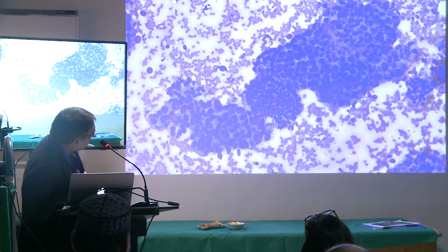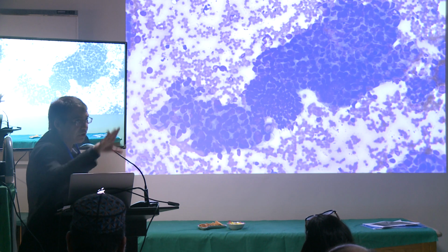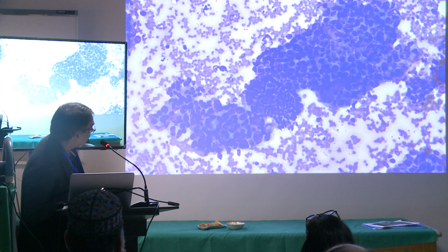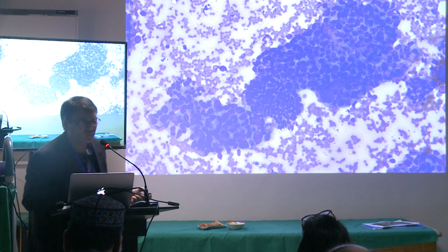Okay, and by the way, these are not from that patient. I have a slide from that patient. I'm just going over how normal and abnormal are going to look. So here it looks really bad. Here they look like they're normal. These ones, you even see a nucleoli here too, and some chromatin there. Really the cell size is quite bigger.